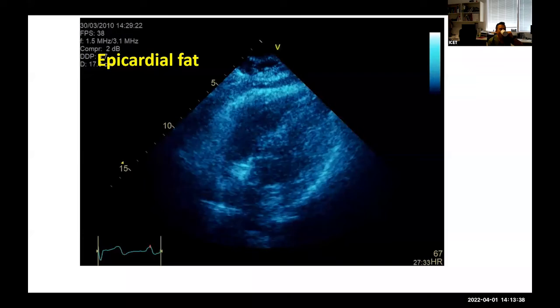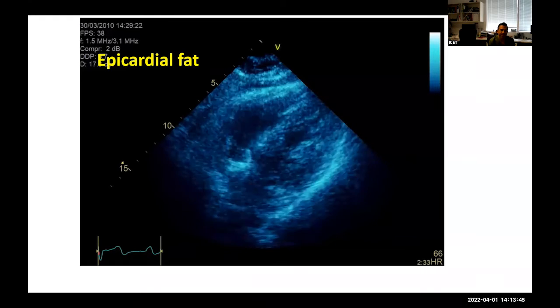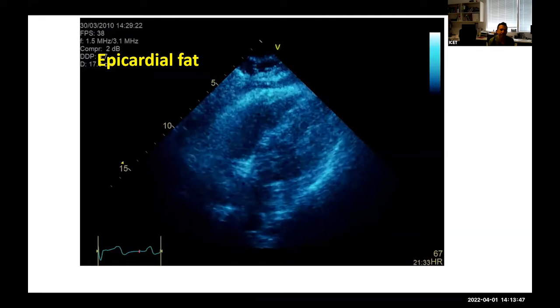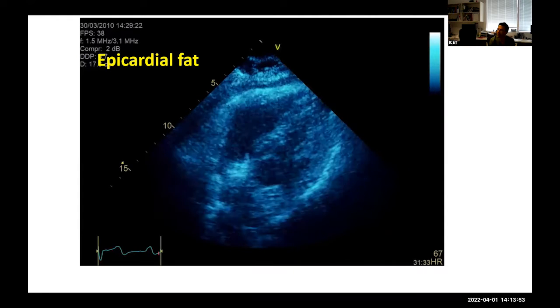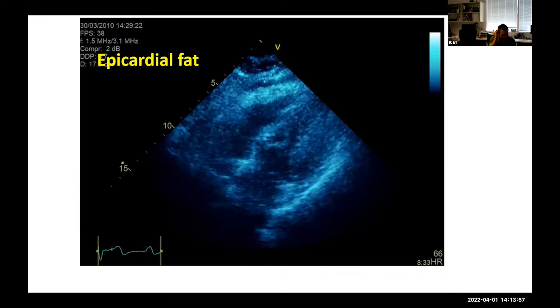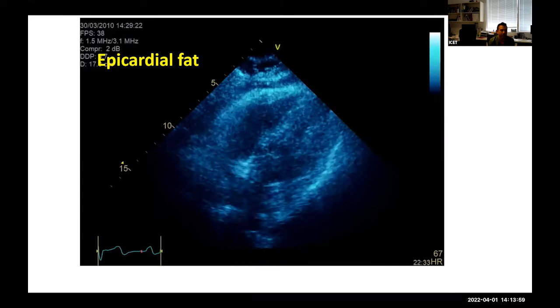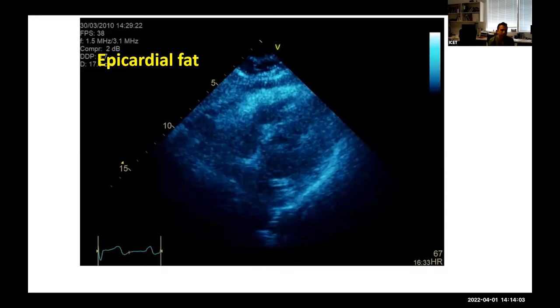The degree of echogenicity of fat can be a bit variable, and it may often be brighter than the myocardium, but there'll always be some speckles in it. I think the pericardial effusions which I have seen are not complicated, so they look more anechoic, free. But yes, if they're complicated, then it will become problematic too.